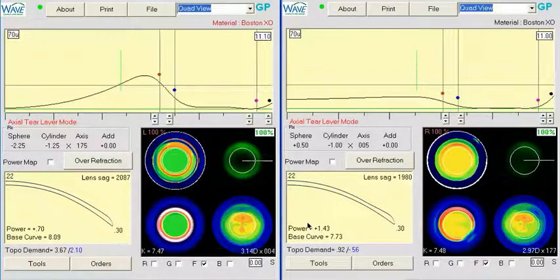This is an ortho-K case where the patient is a little bit undercorrected in both eyes. Looking at the right eye, this is a hyperopic case, patient's plus 50 minus 1. I'm not sure if that's really the initial prescription, but it's a really low prescription to be molding.